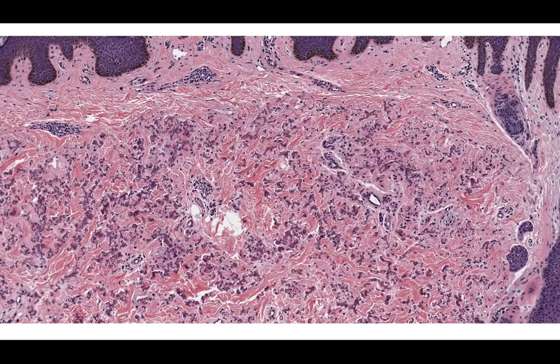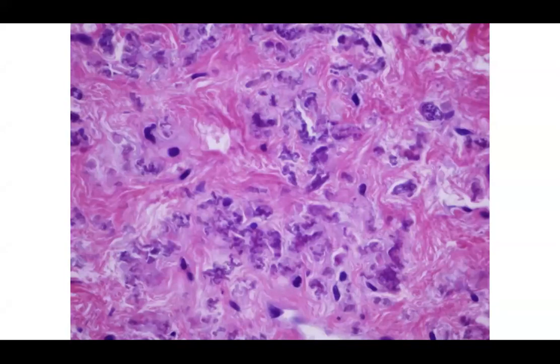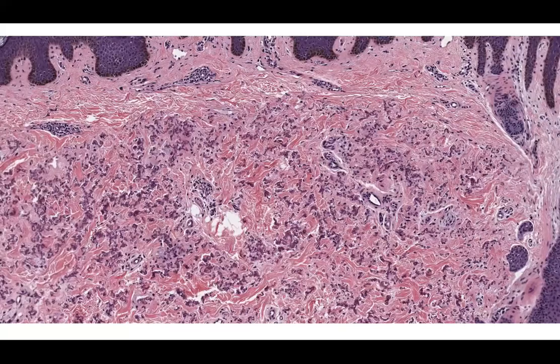However, if you are debating exactly what you're looking at, let me bring to your attention that these appear to be calcified fibers distributed among the dermis. Some of you may have been thinking, are these histiocytes or are they some type of other deposit? However, this is a very classic look of a disease entity. So think about what you think it is. Here's a higher power view just to show you some calcified fibers. Now remember, on H&E, calcified fibers become very purple.